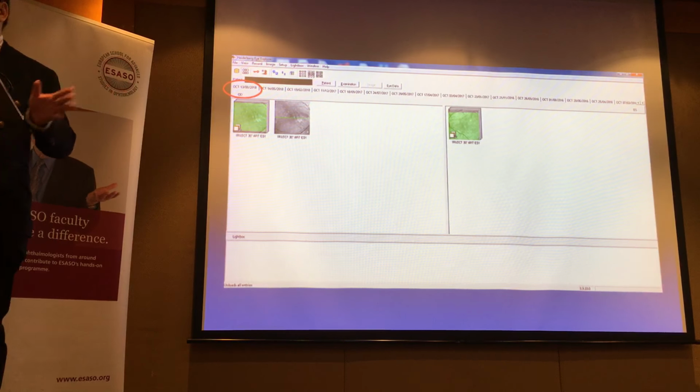And on the Zeiss machine, you have what, 128 or 256, depending on the settings, cuts to go through. I know that's a lot. But why are we just relying on 1 or 2 cuts if that's the case? Why do we then bother to do the other cuts? So I think one of the pitfalls is to do that, and my suggestion is review the entire OCT scan. Okay? Something like so, and each of these gives you, so it looks fine so far, but there we go. Right? Do you see that?